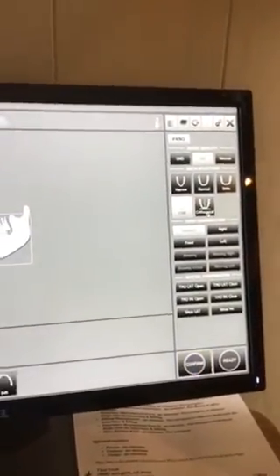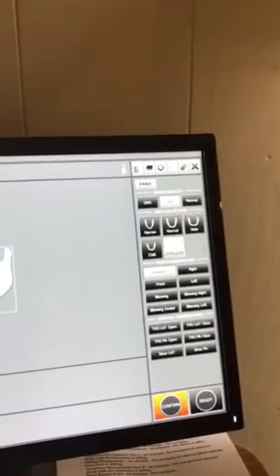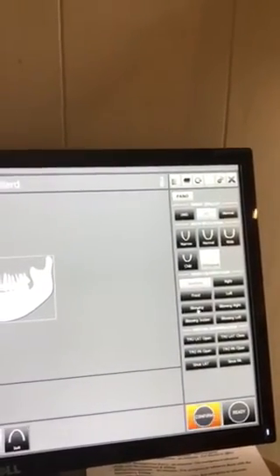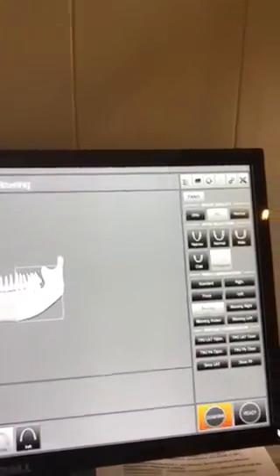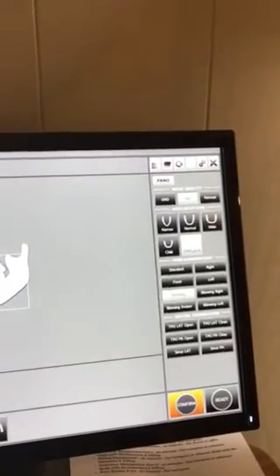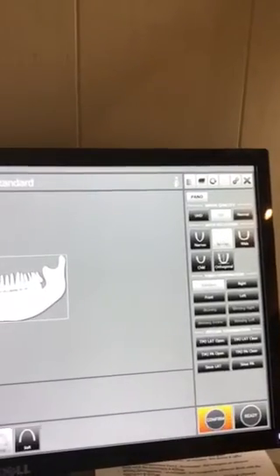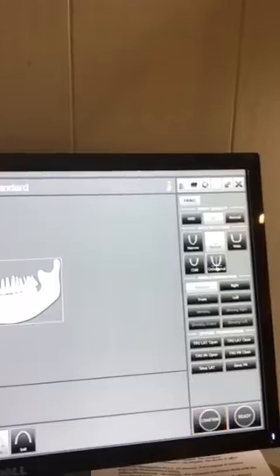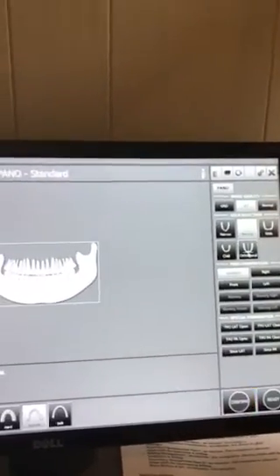Now if you wanted to use the bite wing function on this, you click on orthogonal, and the parts that were grayed out on the bite wing automatically come up for you to choose bite wing, and you do that. You can do all your TMJs. Now if you're just doing a normal pan, go back, make sure the normal is highlighted. This bite wing feature here, it does take a bite wing, but what it is is just a pan with the anteriors blocked out.